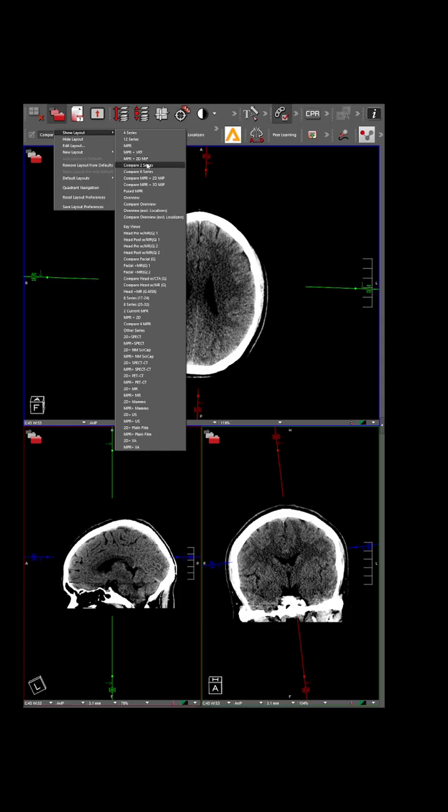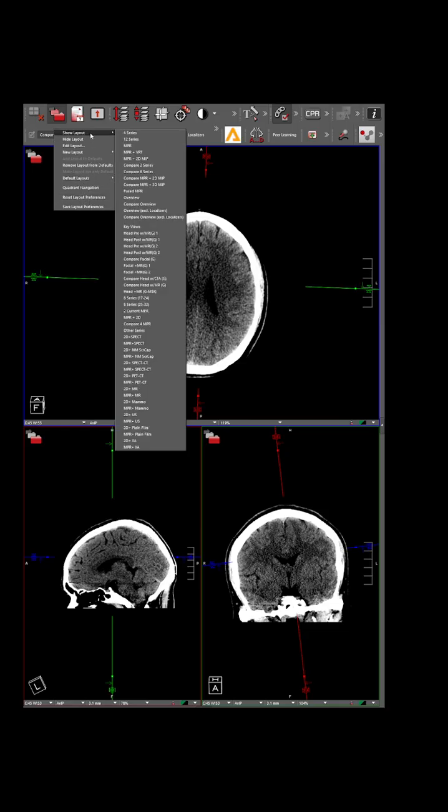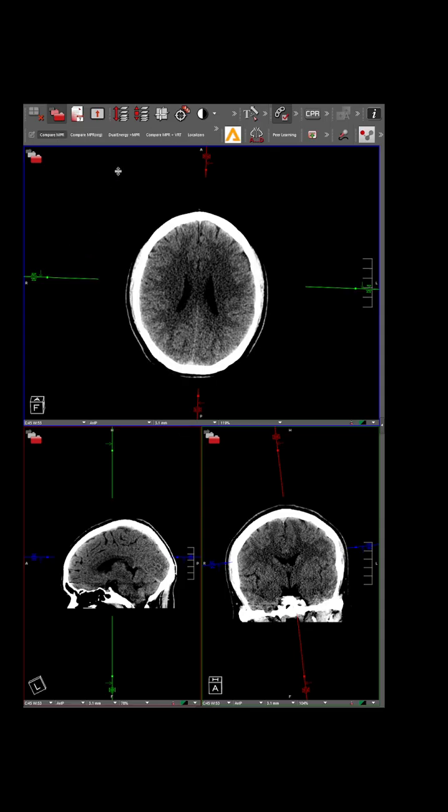selection of hanging protocols. You can create a layout using this tool, and then there's some other additional tools elsewhere in this menu, but I don't use these as often and they're less important, so I'm just going to highlight the most utilized and perhaps most useful tools. You can rearrange by clicking and dragging here.